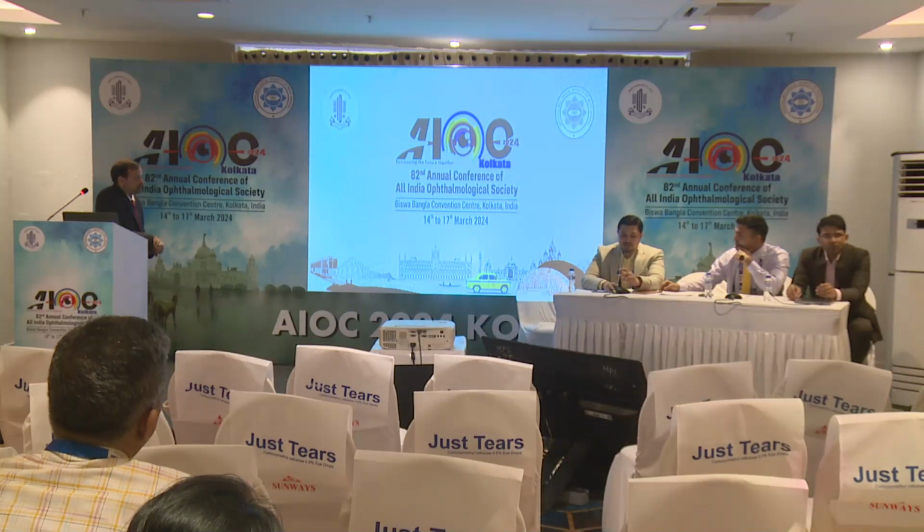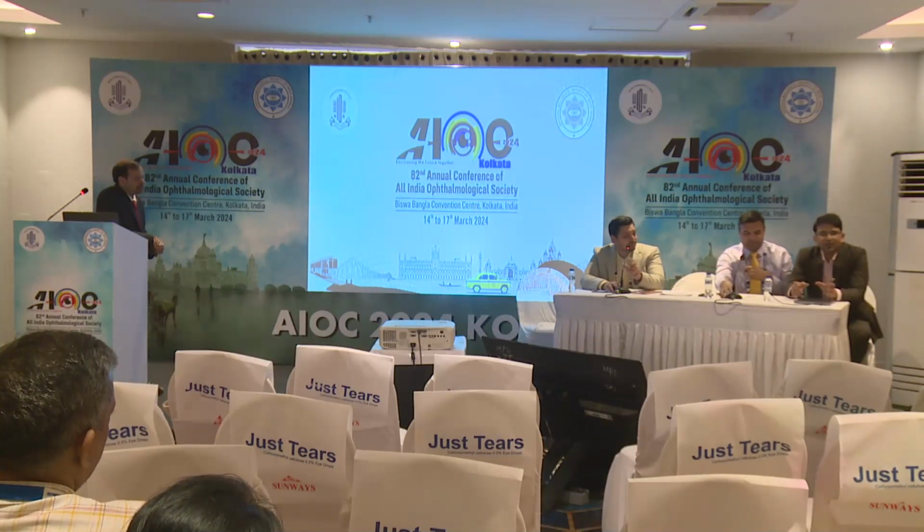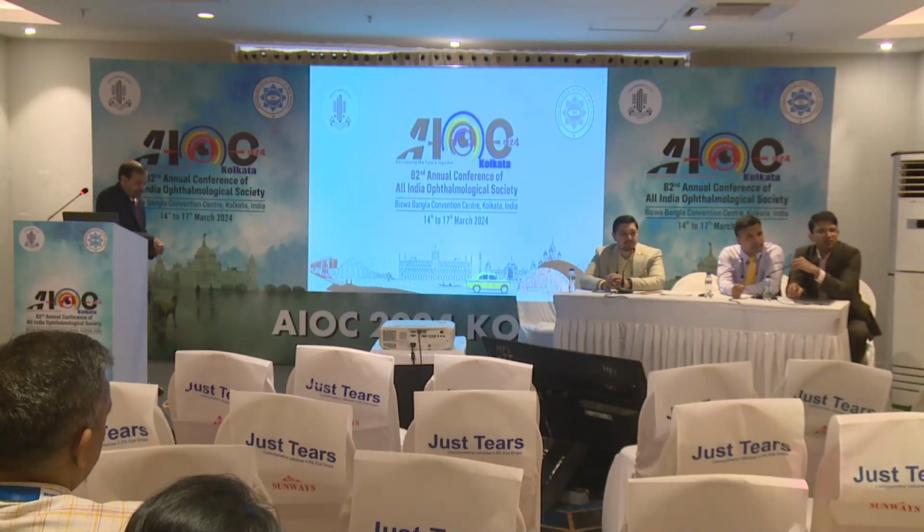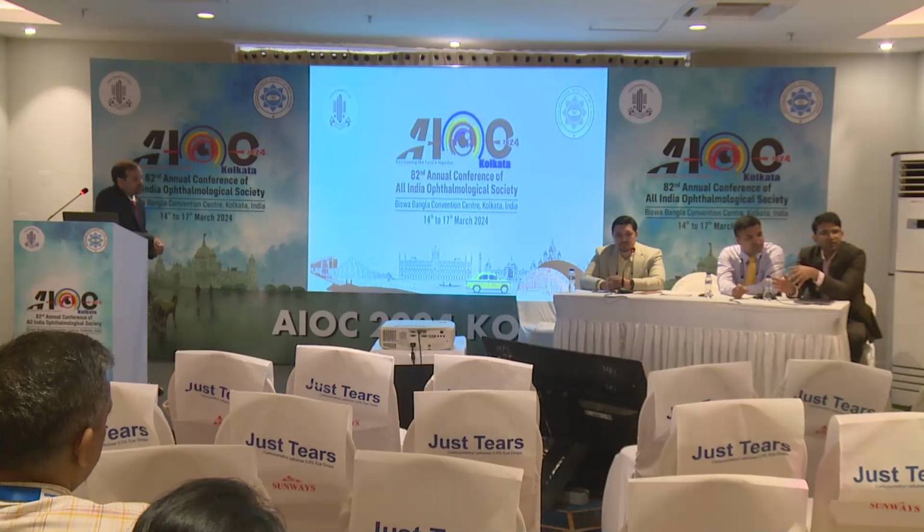I think other than the FAZ area, as I just showed, it's the circularity index that has come up. So even if the FAZ is not circular, if it is distorted in one part, it will signify localized ischemia. So rather than focusing just on the FAZ area, you may sometimes be interpreting erroneously.